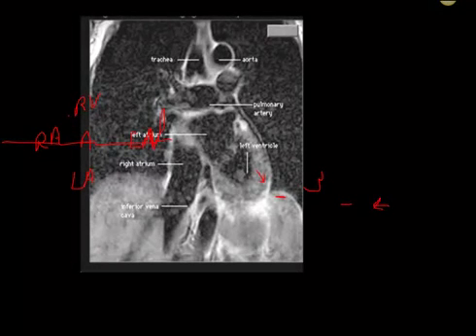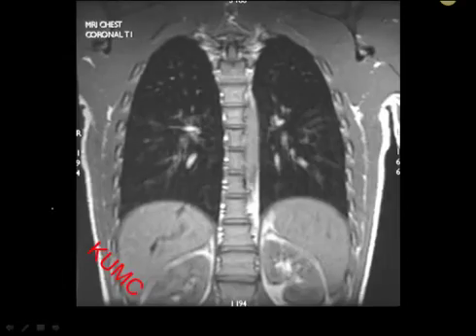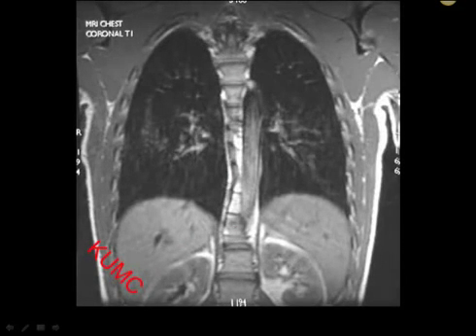This is further back posterior, and in fact where we are is in that left atrium. So we're actually on a plane that's back in here. So you can use the carousel of the heart as a road map. Okay, let's go all the way back. Now, this is from another website. As you can see, it's Kansas University Medical Center. We are way, way back posterior. In fact, you can see where all of the spine is here. I'm not asking you yet again to memorize these things. I just want to show you some of this.